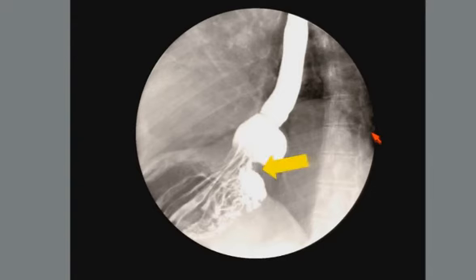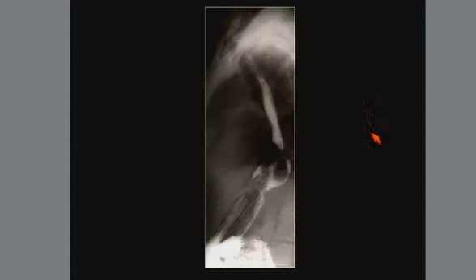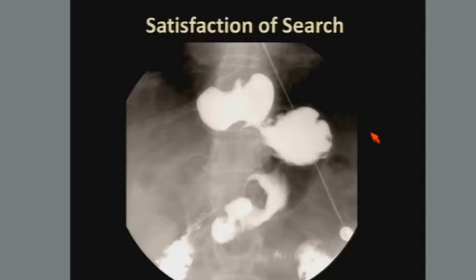Another patient here, the wrap has mostly dehisced, but you can see it's clearly too low, extending around gastric folds. The GE junction is here as well in the chest, and this patient has a short esophagus. This patient has an intact wrap here, unfortunately moved into the chest, and you can see the hiatus here as the pinch where the gastric folds cross the diaphragmatic crus.